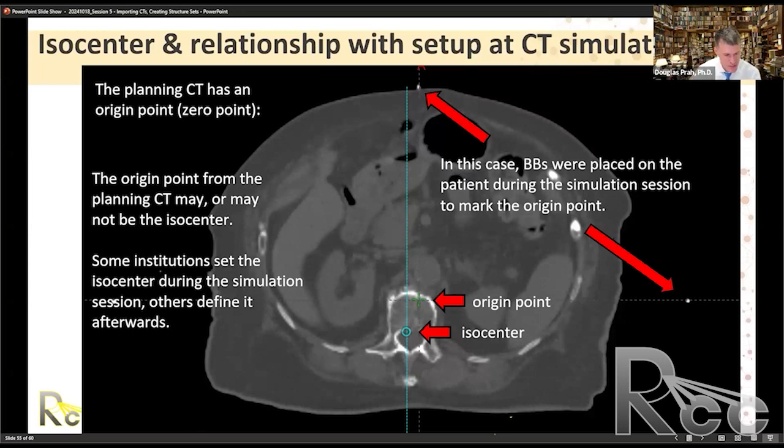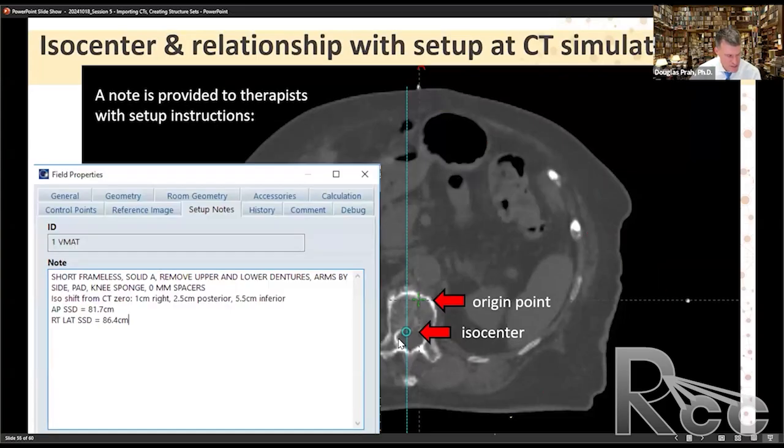But in general, too, you want to make sure that wherever you put isocenter, you don't end up having the gantry run into the patient, right? So if it's a larger patient and I put isocenter here, I might not be able to get a beam from the other side if isocenter is located too far laterally. So just be cognizant of where you're going to do that.